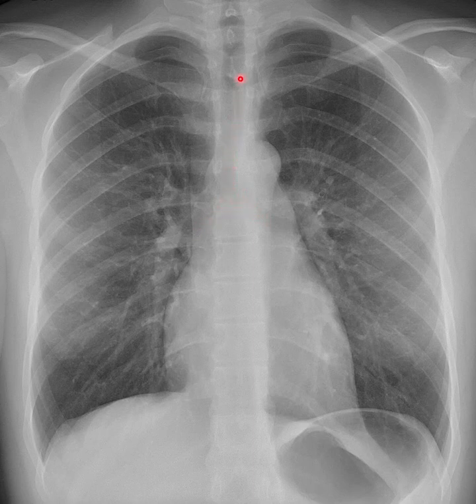All right, then we will look to see that we have the aortic arch here. We can identify the aortic arch. We'll be looking to see the entire heart shadow in the image. We'll want to be able to see the spine through the heart shadow. We won't be looking so much for spiny structures on the vertebra, not the vertebral structures, but we'll look to see the shadow of the spine through the shadow of the heart. That way we know that we used enough kV to penetrate all the way through the patient.